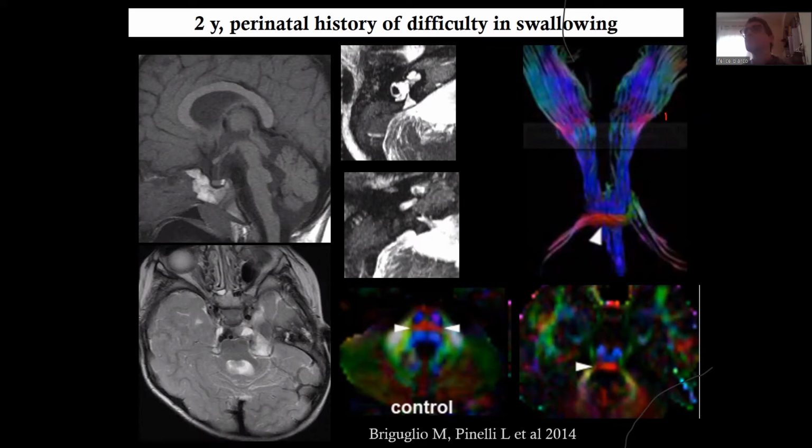And this is important because I did a review 1 month ago on a paper that was sent to a journal, and they called this pontocerebellar hypoplasia. And I had to say, listen, they were wrong. This is pathognomonic of what is called pontine tegmental cap dysplasia, PTCD.